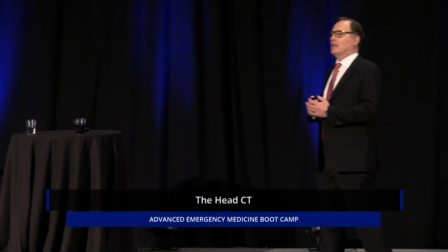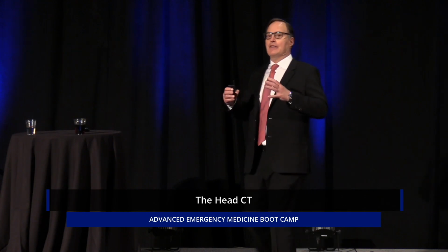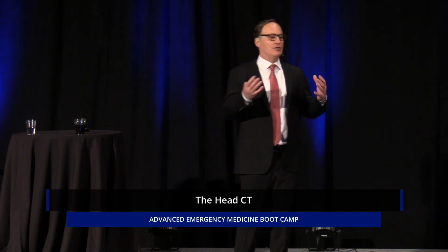So we're going to go quickly through how to approach imaging of the brain. Then the three of us will actually go through a little bit of radiology jeopardy.